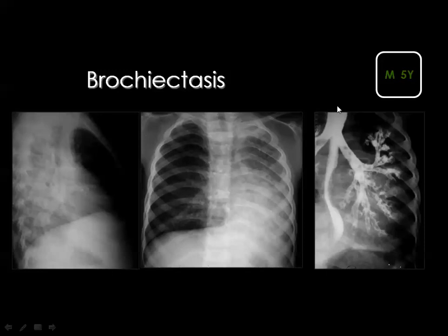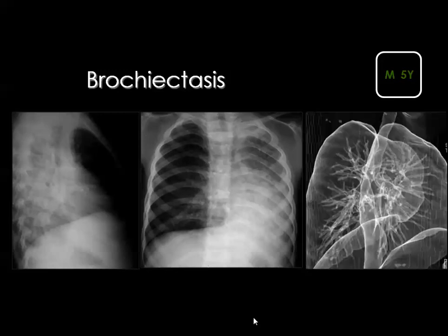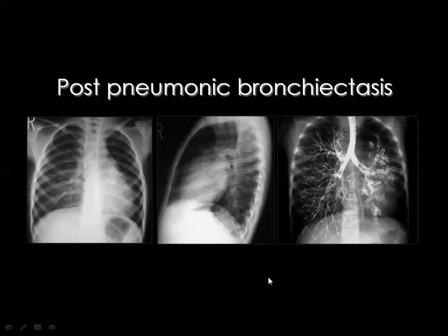And this is the old technique known as bronchography, where you inject a radiopaque material inside the trachea after doing surface anesthesia for the tracheal mucosa. Then you see the contrast material within the dilated bronchi confirming the diagnosis of bronchiectasis. But nowadays you can see the bronchi through multi-detector CT without the need to inject contrast media or do this obsolete technique.